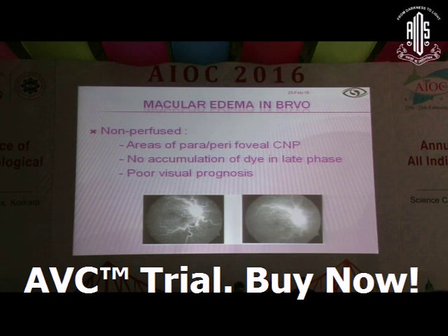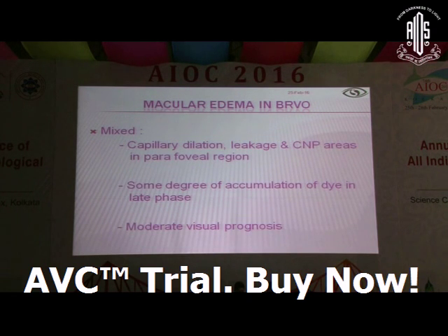As you see in this, there is a total loss of the capillary foveal avascular zone. So this will be a non-perfused macular edema, and this, in spite of whatever treatment you do, will carry a bad visual prognosis. And most of the time you would see a mixed response where you will have a bit of perfusion and some areas of ischemia.